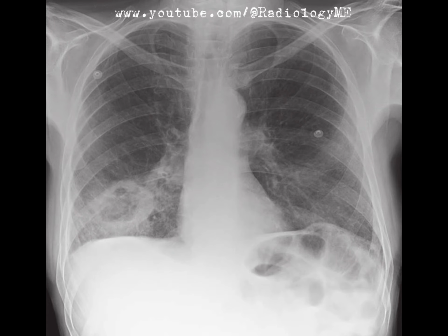The first question that comes to mind is whether there is any sign of bone involvement or destruction, something that can often suggest malignancy. However, in this case, no bony destruction is visible. The mediastinum and the remaining lungs do not show any other focal lesions, and both hila appear normal without enlargement. There's some airspace opacification medial to the lesion, which could indicate associated consolidation.